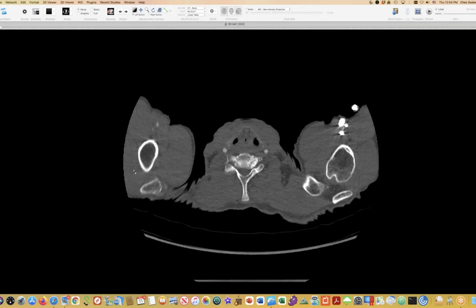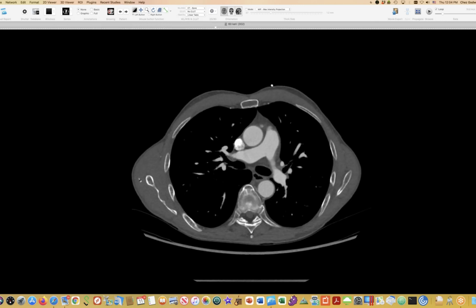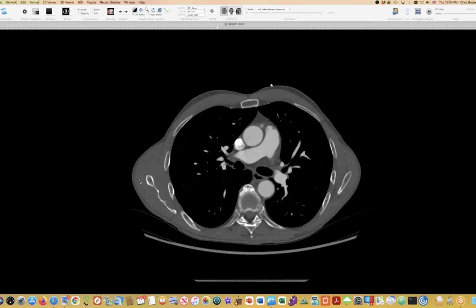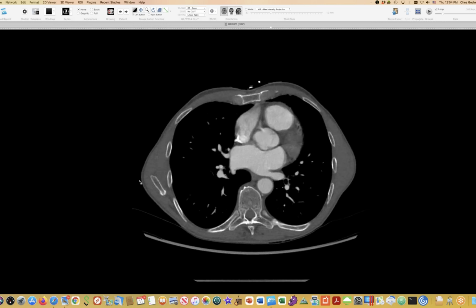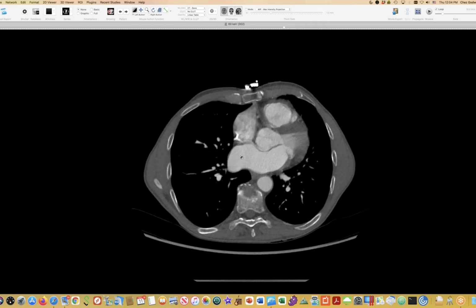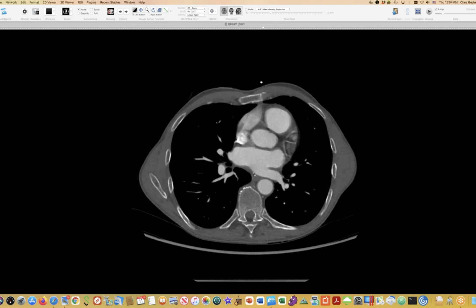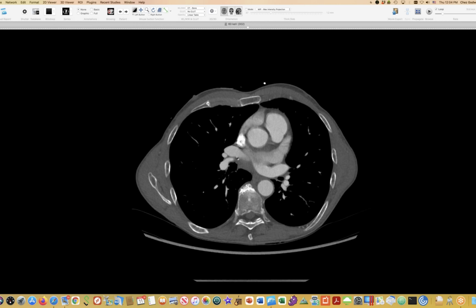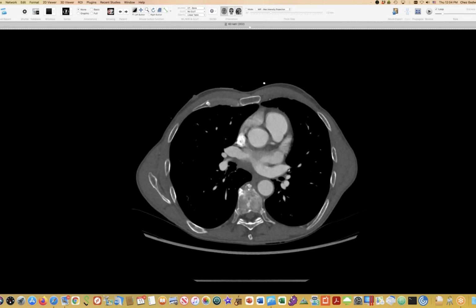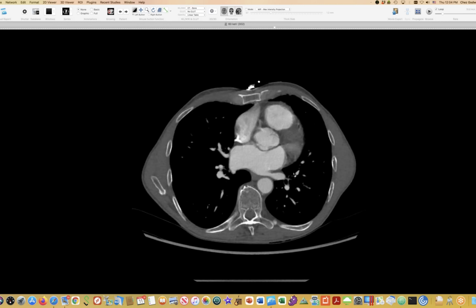Okay, let us proceed to cross-sectional imaging. This person has a normal-looking size of pulmonary artery, although there is some degree of pulmonary hypertension on echo. And then has a large left atrium. And indeed, the bulge is caused by a pulmonary varix. So notice that the pulmonary veins are juicy in general. So here's the upper pulmonary vein on that side. Pulmonary veins are substantial on the other side too. I mean, not huge, but a little bigger than normal.